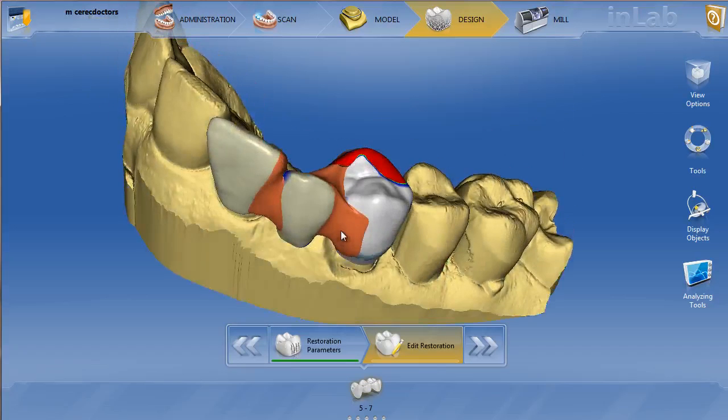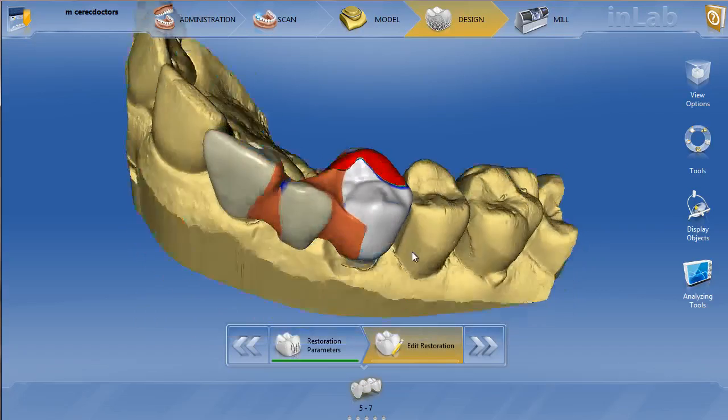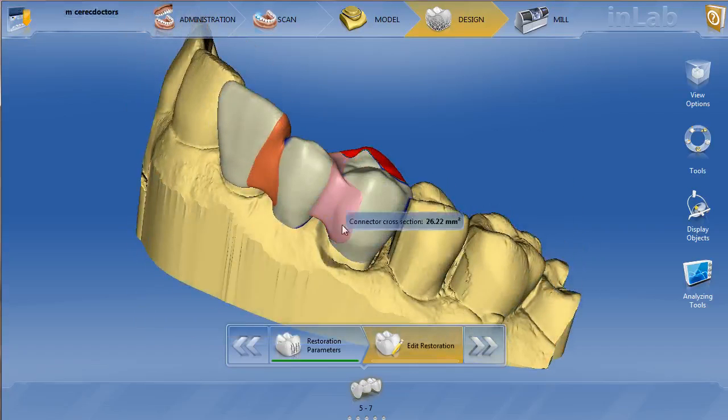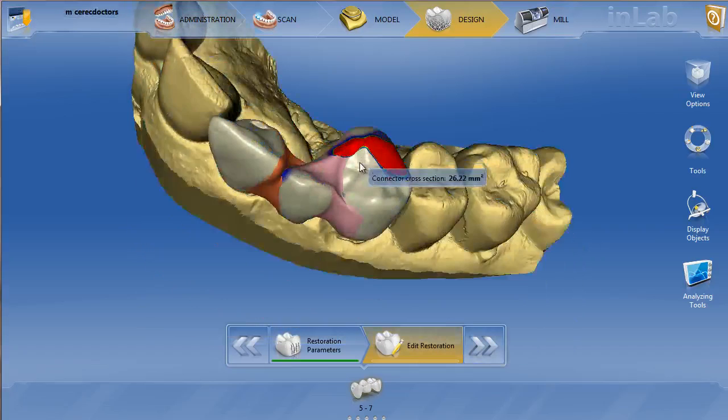Now let me tell you the difference. Normally in version 4.0 or any other chairside version you've ever used, when you do a bridge or a temporary bridge, they all appear to come together like normal teeth. You know, they have nice embrasures, and that's an intersecting connector. When you choose an anatomic connector, this is when they actually place physical connectors or bars in between the teeth, and it's usually chosen for bridge frameworks. So because I see these connectors between the teeth, because I can double click on them and actually right click and adjust these, then I know that the dentist chose the wrong connector.